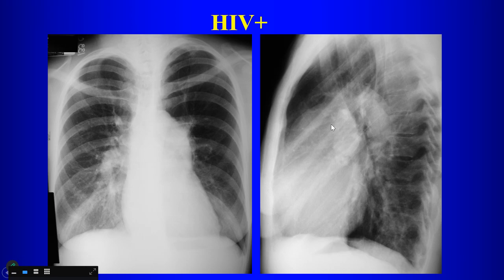What is this? Lateral chest radiograph. What is this thing? What makes this shadow on the lateral chest radiograph? We covered this in the first lecture as the right hilar vascular complex, but in this case, this is going to represent what? That superimposition of the main and the right pulmonary artery on the lateral chest radiograph. You can also see that the right pulmonary artery is somewhat enlarged. So putting all this together, it suggests that this shadow is what?